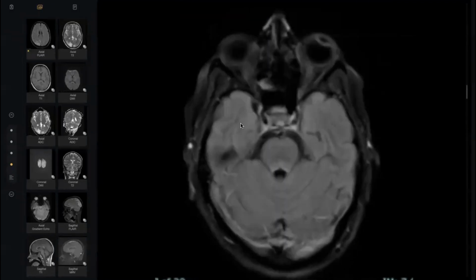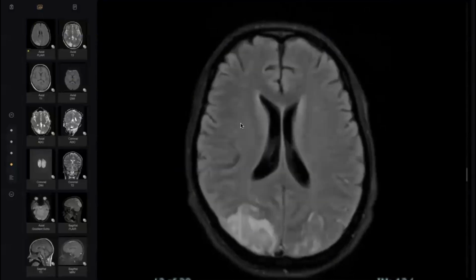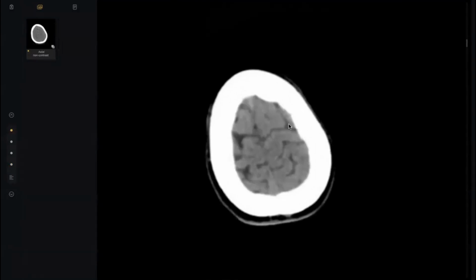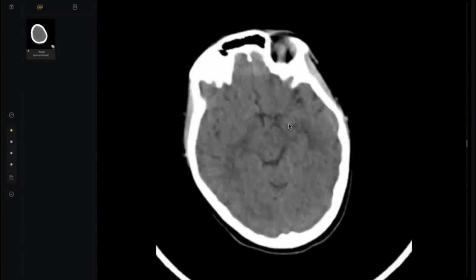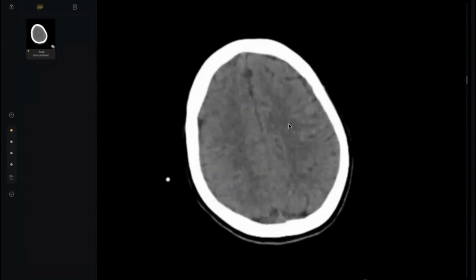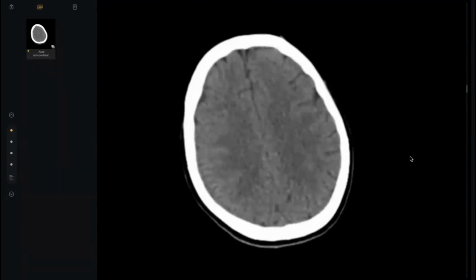Sir, just one quick question. If the examiner brings a CT like you did and I wasn't able to get anything out of it, what will be our first step? Either ask for history or ask for MRI. Okay. But here, I think the CT was not conclusive at all. So ask for MRI. Sometimes they want to assess what is your next step.